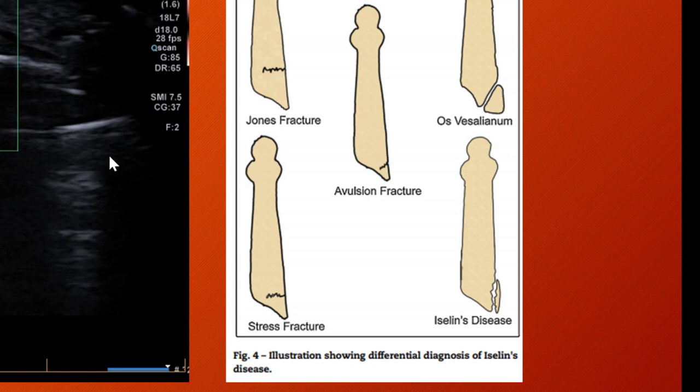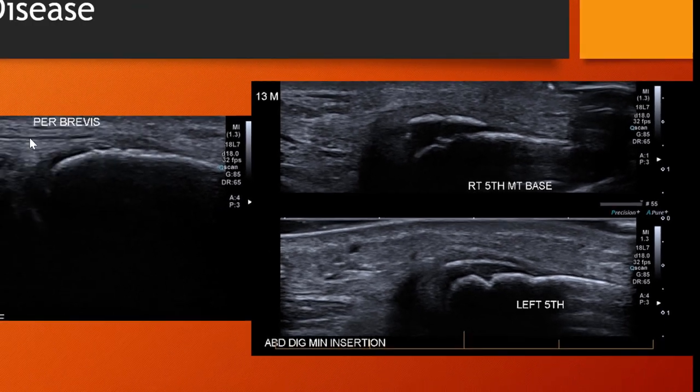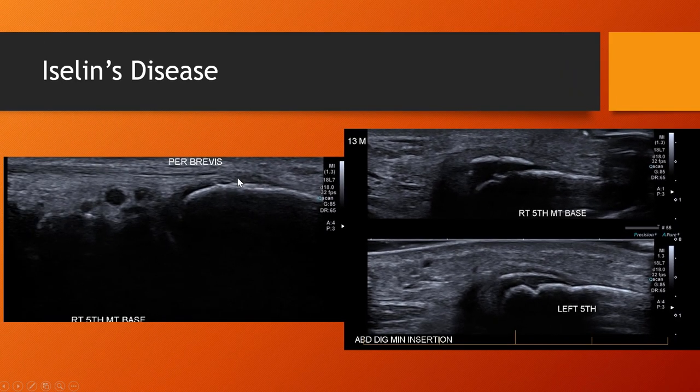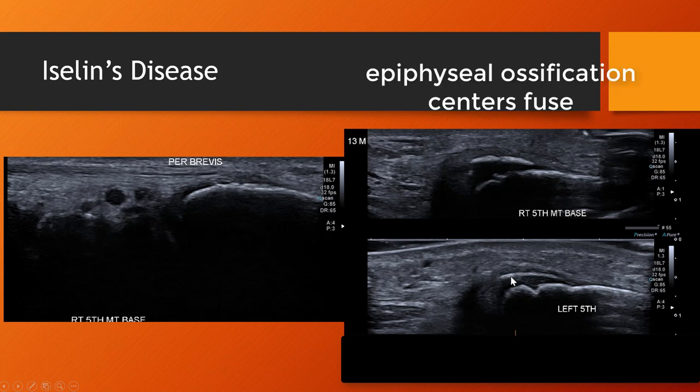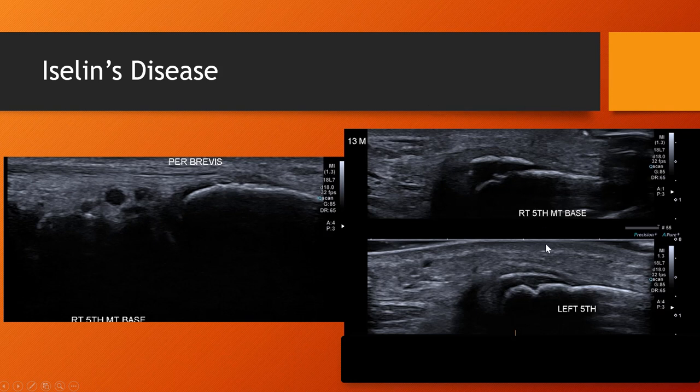And in this young male, the peroneus brevis insertion looked completely normal. There was no bony ossicle and no thickening or periostitis. And it was a bilateral occurrence for him. So these fuse at a certain age, so just seeing bone here is not necessarily abnormal, but in this case it was clinically tender and hypervascular.